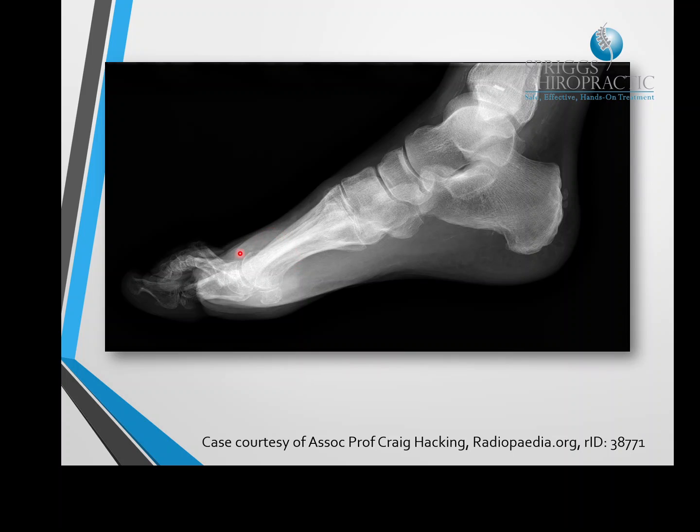The reason why I'm using these cases as well is because a lot of people are fooled into thinking that x-rays aren't all that great for visualizing soft tissue, but ultimately if you've got a decent machine, you've got your collimation down, you've got your exposure factors right, you will see a lot of soft tissue involvement. X-rays are by far and away the easiest way to diagnose gout in particular, and obviously joint arthropathies in any place.